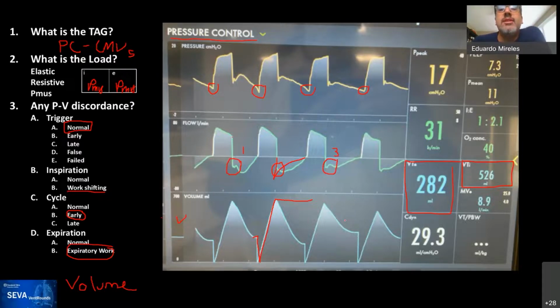Another common question, since this is the forum, and I'll put it out, is, can you ventilate somebody with a leak? How? This is a common item in which we see a leak and we start trying to do everything to occlude the leak, especially when we're talking about a tracheostomy, or an ET tube. So we put more air, try to inflate the balloon more. And so the question here is, when does this affect ventilation? Any thoughts? When would you say that a leak is okay?